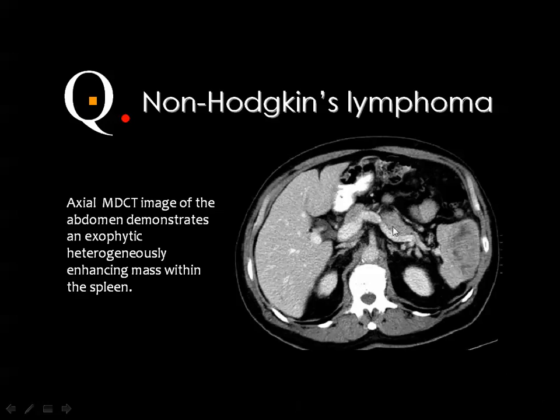And this is the body of the pancreas and the splenic vein, and there is some partial volume averaging here. The neck of the pancreas is not appearing in this section. This is the IVC, I think, and this is the splenic vein, and this is the portal vein.